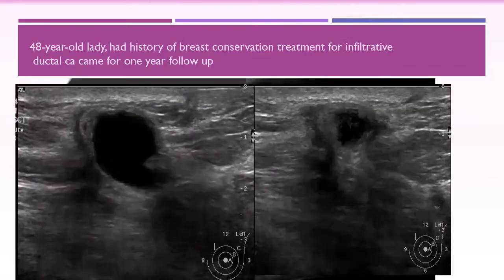And what about ultrasound? Does it help you? Ultrasound. This was the previous one, and on the left... yes, the right, same order. The one projecting over the previous, and the other one is the recent one.